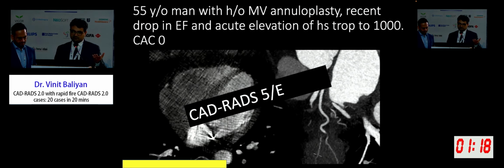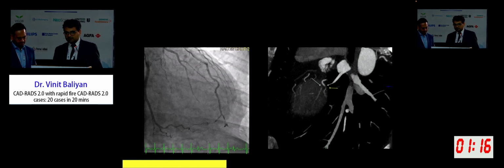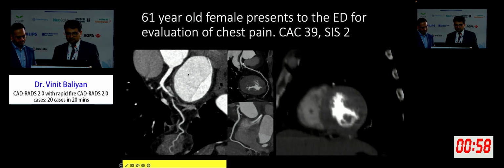And more interestingly, the patient was put on anticoagulation. So this was called a 5E, and put on anticoagulation, and several days later they did a cath. So now this is the same point. Now you don't see any filling defect. Here you see, I mean, abrupt occlusion of the posterior subbranch. So maybe that thrombus dislodged and embolized more distally.